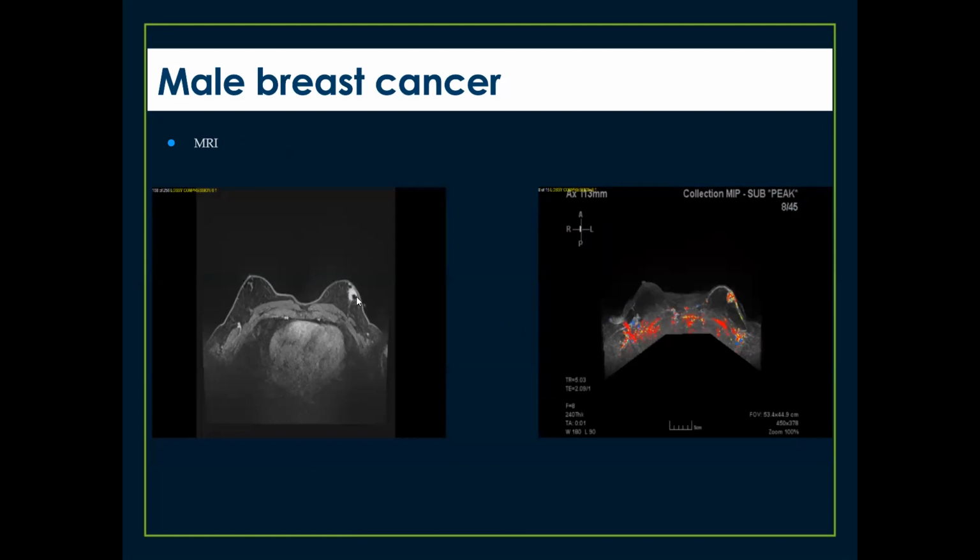And this darkish area right here is some susceptibility artifact from the biopsy marking clip. The clip is sitting within the enhancing mass. And this is a summation or MIP image demonstrating no suspicious findings in the right breast. In the left breast, there's a color overlay map with predominantly red, which is the type 3 kinetics, or the most suspicious type of kinetics.